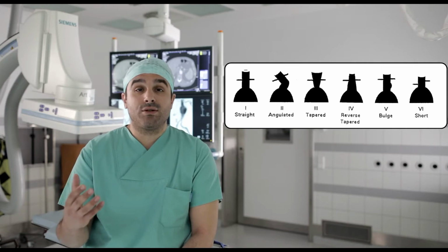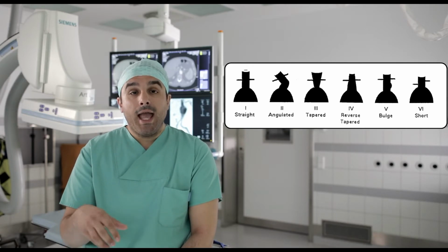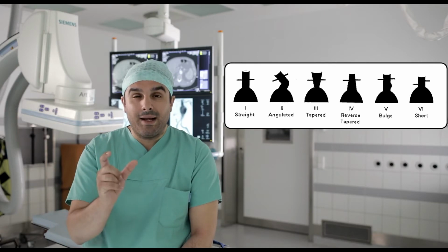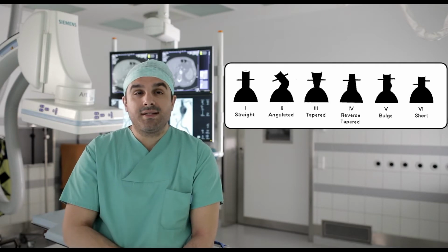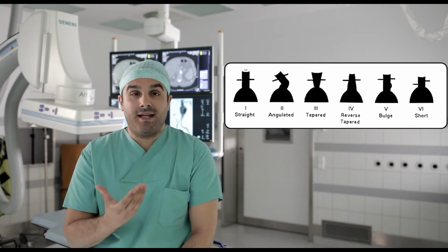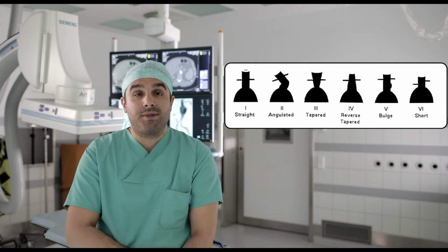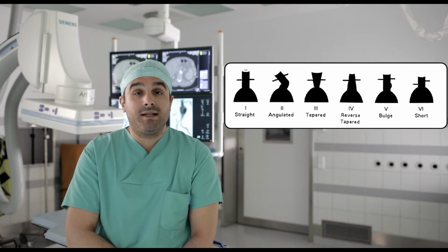An angulated neck, here you have to check the angulations according to the IFU of the device. A tapered neck, you have to oversize based on the diameter below the renal arteries. A reversed tapered neck, be careful for adequate oversizing based on the biggest diameter, 15 millimeter directly below the renal arteries.